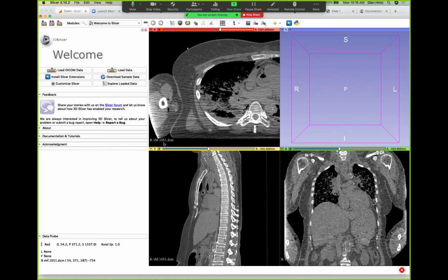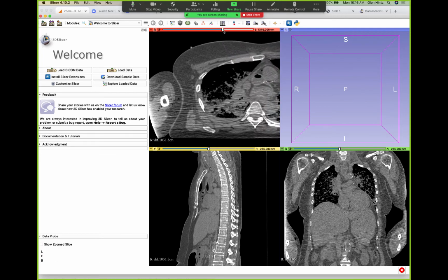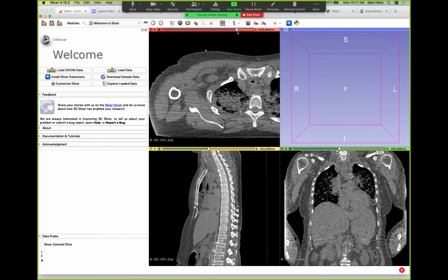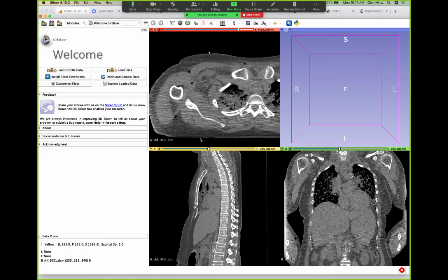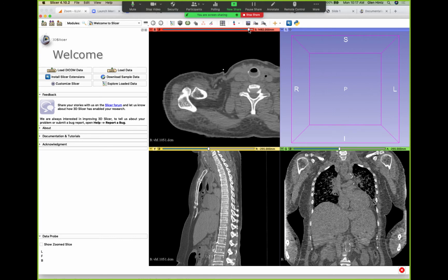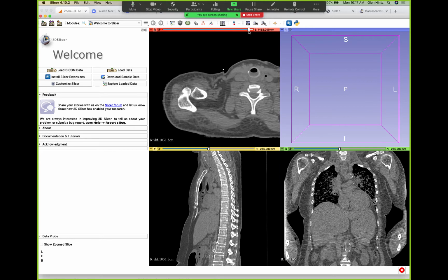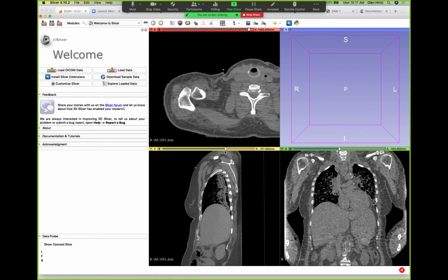So I'm at, I'm not sure if this number will change, 1051 I think is the top. Right there, watch that little spot. That's the tip of the scapula. Okay. So I'm going to know that that's what I want to go through, and you can actually go all the way up and see the scapula, the acromion process start to articulate right here with the clavicle. So you do the same thing below. Just decide if you're doing the left shoulder, you want to do the left.